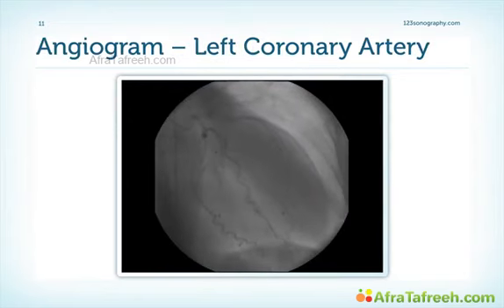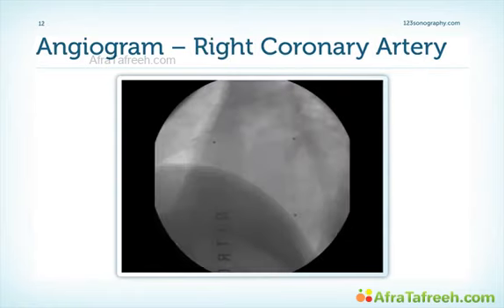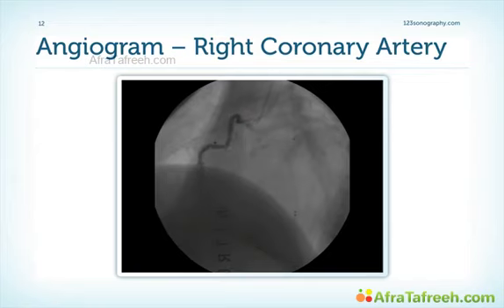So what we see is a completely normal left coronary artery and also a normal right coronary artery. So the patient does not have coronary artery disease.